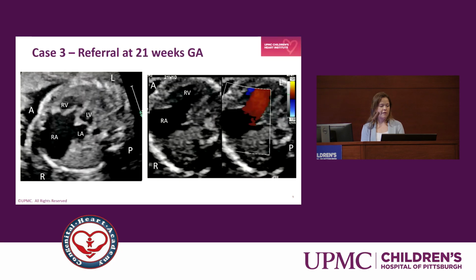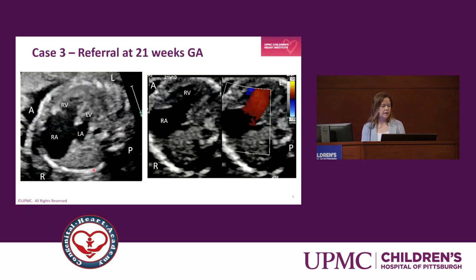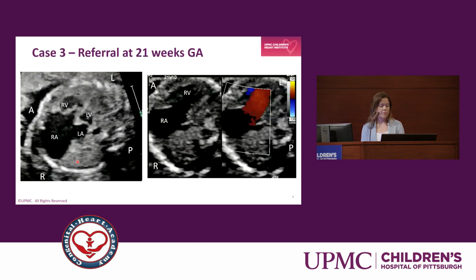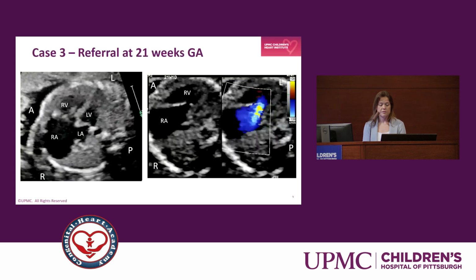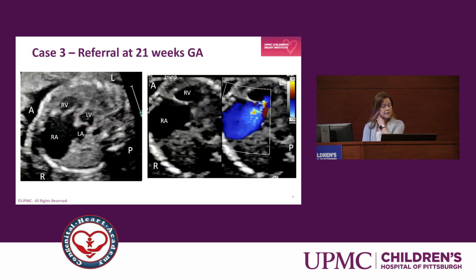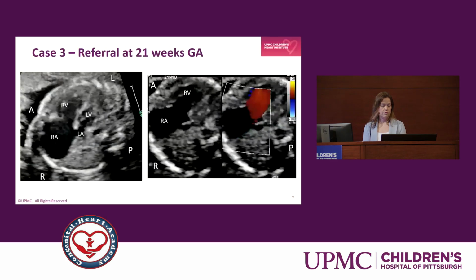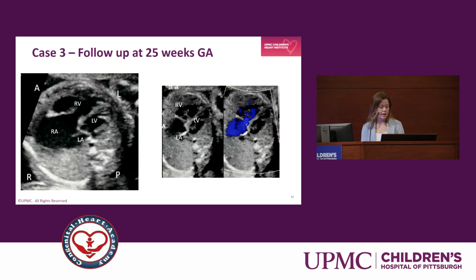The tricuspid valve annulus dimension was large, and there was significant tethering and displacement, not so anatomically distally displaced, but significant tethering of that septal leaflet, and with color, severe tricuspid insufficiency. The right ventricle was actually dilated and had preserved function. Although not shown here, no forward flow was noted across the pulmonary valve at that time.